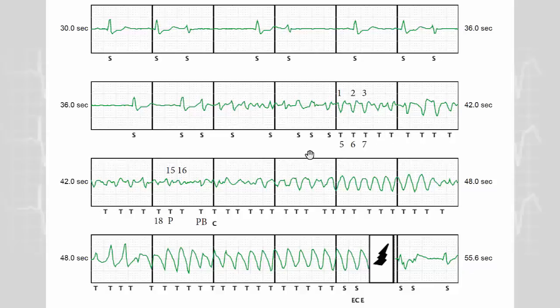The device uses an initial non-programmable 18 of 24 duration criterion prior to onset of capacitor charging. It means that the device will recognize an arrhythmia when 18 of 24 consecutive sensed events exceed the programmed detection zone limit.